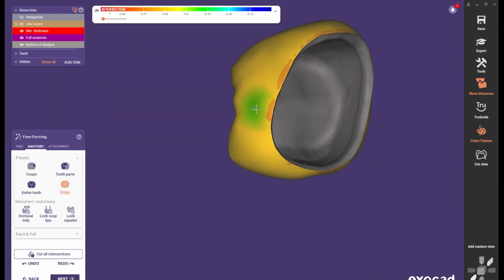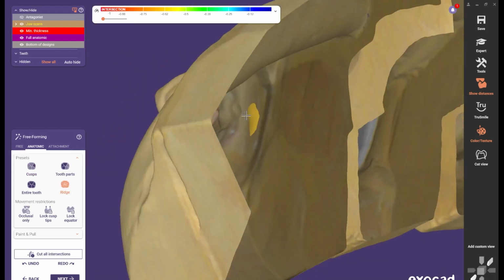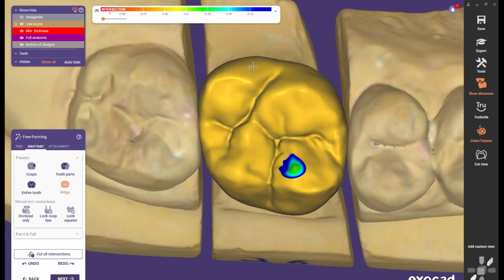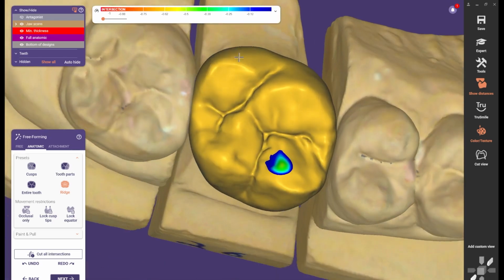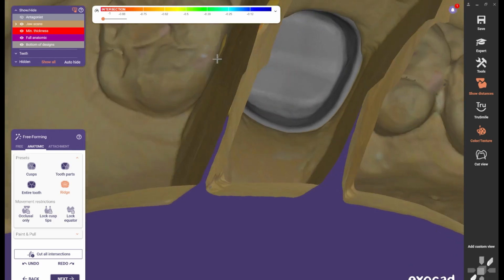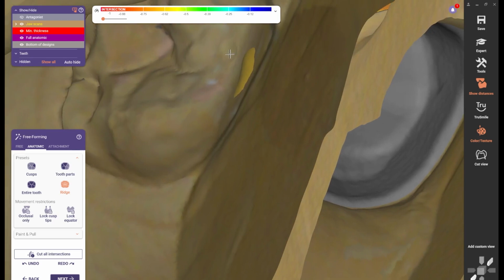And then from here. You see you have somewhat of a surface here. I don't want too much, just a little bit in here, so you can barely see anything. You don't want it like this. Also, if you use Ctrl and Z, it does the undo.